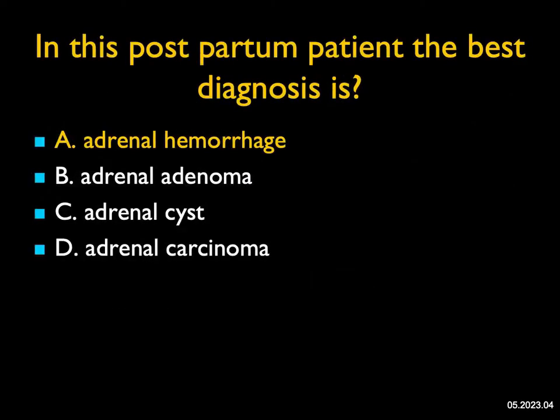Now, whether the hemorrhage was during the patient's pregnancy or before, I don't know. But adrenal hemorrhage can be one of the trickiest findings, particularly when it's not acute hemorrhage. Acute hemorrhage tends to be easy, very bright, often a history of trauma, but the brightness, the oval appearance, here it's much trickier. We've seen a number of large adrenal lesions end up being hematomas. Just a tough call.